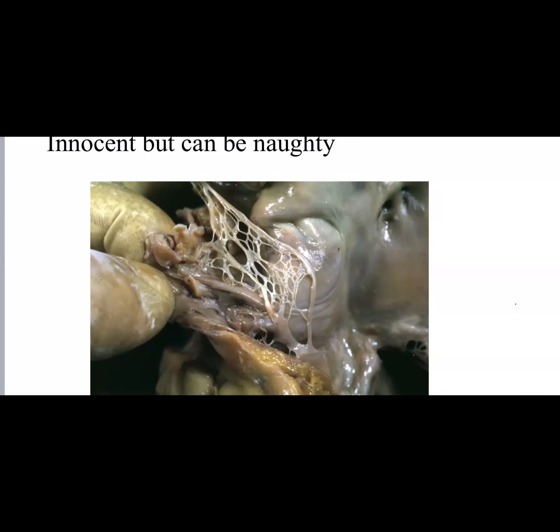Give me options, please, Dr. Hatem. I'll give you options. But I think somebody has said it already. Sorry? Chiari network. Chiari network, exactly. That is the Chiari network.